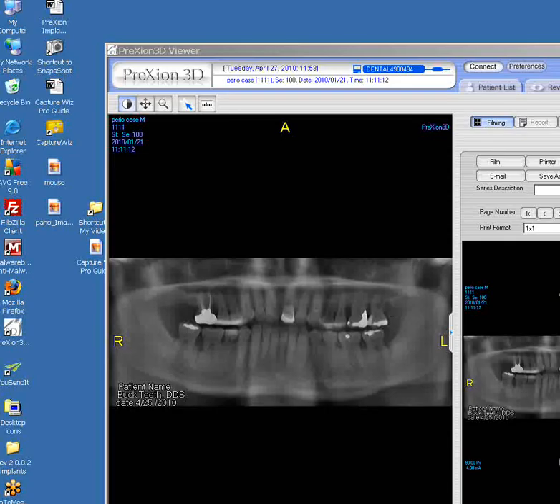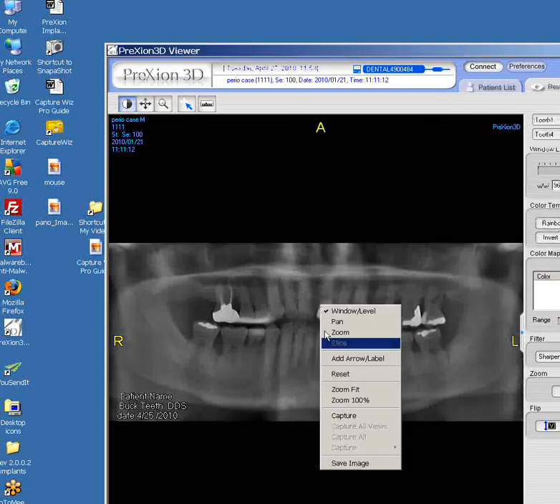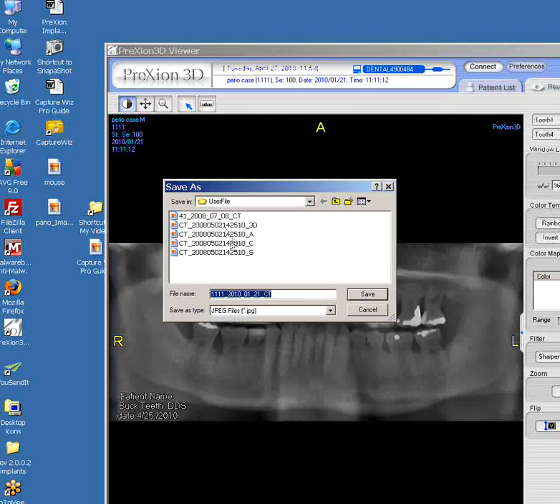And once again, they do not have to save to the output panel if they don't wish. They could simply go back to review mode here and simply right click it and then hit save image, and then you could save it to a particular file again. Just rename this as we did before, and then save it to a file, and then one can recall it later. And this is to benefit if they wish to crop it, and I'll demonstrate this here, how to crop.